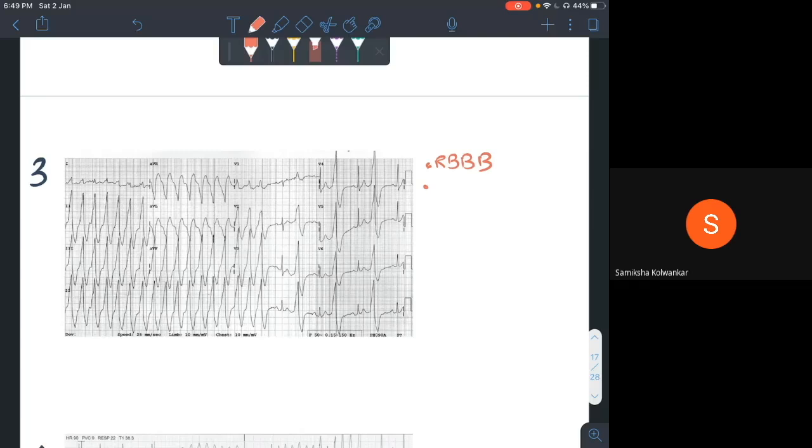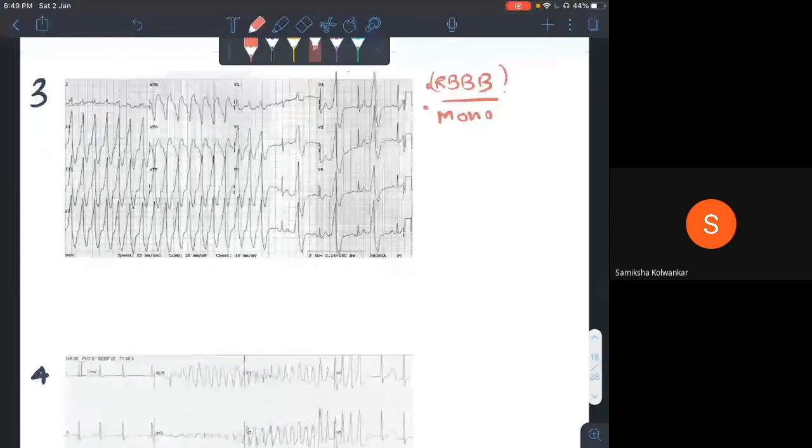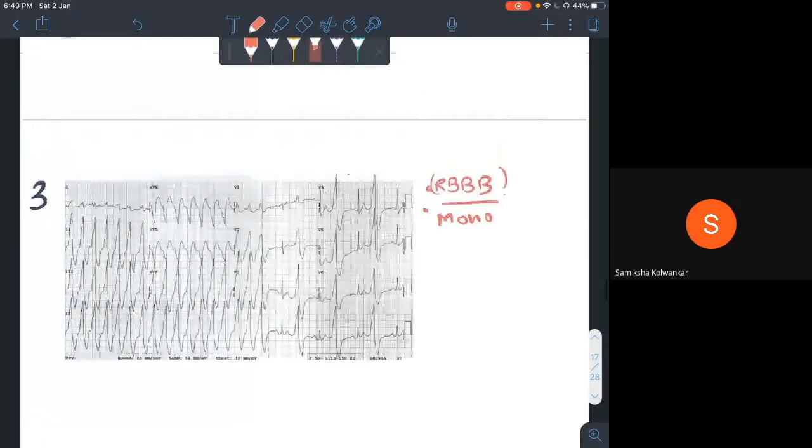Okay, I'm just going to quickly tell you guys, let me clear this doubt about it being RBBB. This is asystole, I mean a monomorphic VTAC. This is not an RBBB because, like I said, in an RBBB your ECG basically looks normal. It's just that your QRS complex is greater than three small blocks, which is greater than 0.12 seconds. Everything else is the same.